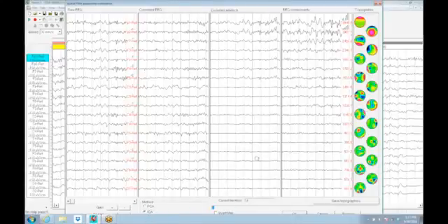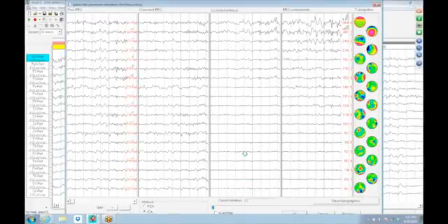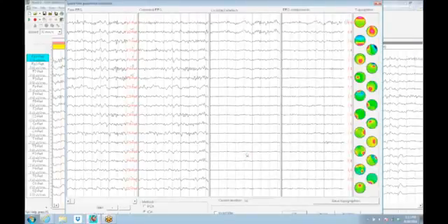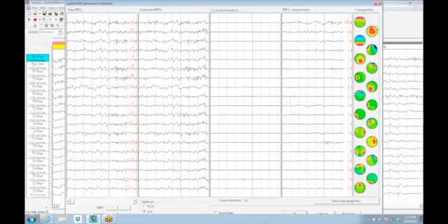Now, the learning algorithm is going back through the EEG, and it's taking its time, going through a number of iterations, learning the raw spectra. It's just finished, and now you can see the generators are more discrete spatial generators. And the top one is automatically selected. I'm going to deselect it so that we can see the display.